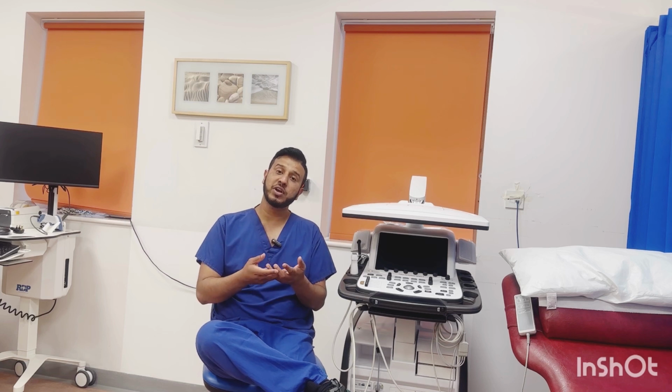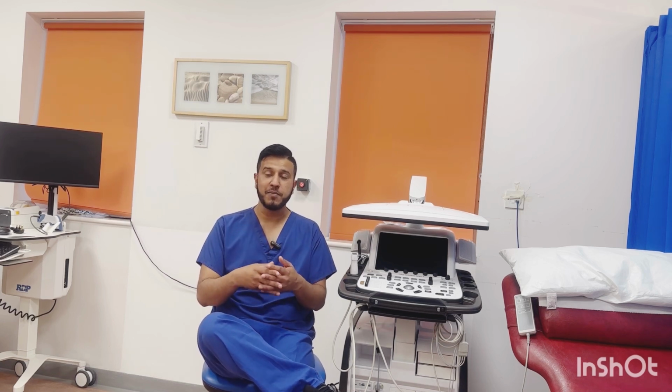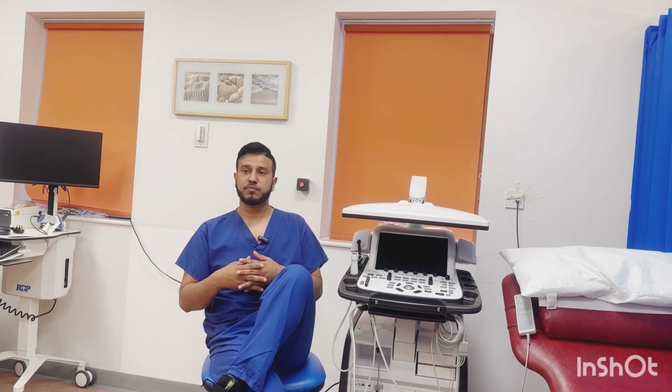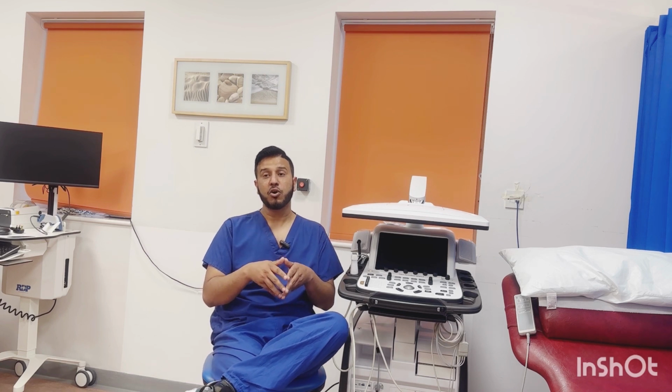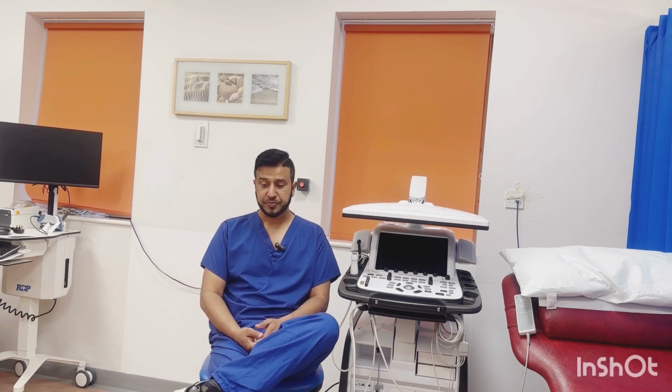So what we should do in this particular situation? These days in the echo lab, we are encountering these patients many times. So how are you going to report those patients, or how are you going to figure out whether this aortic stenosis is severe or not severe? This is very important to learn.